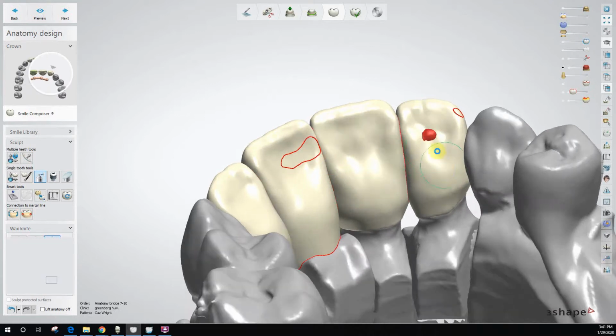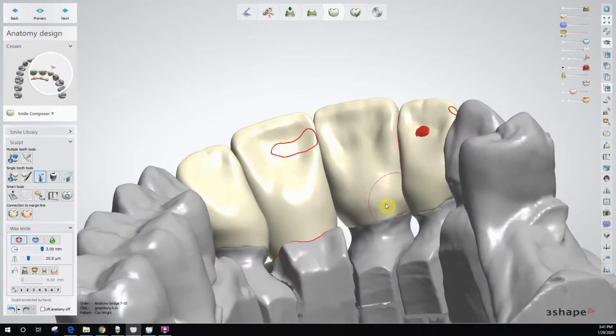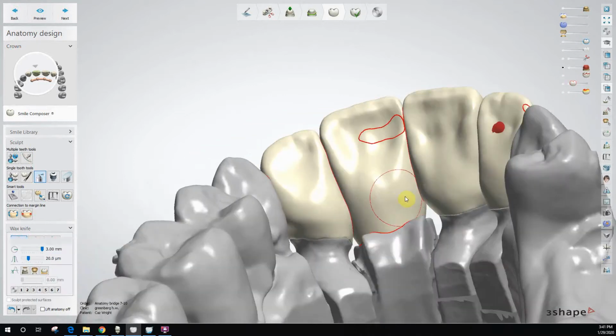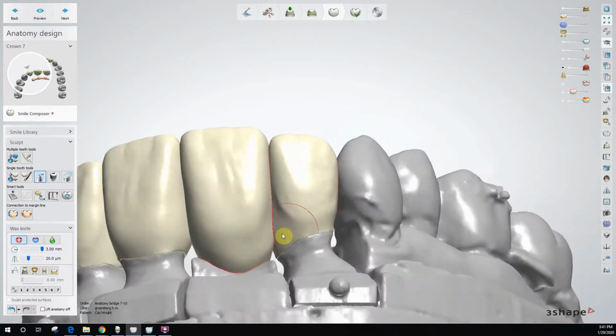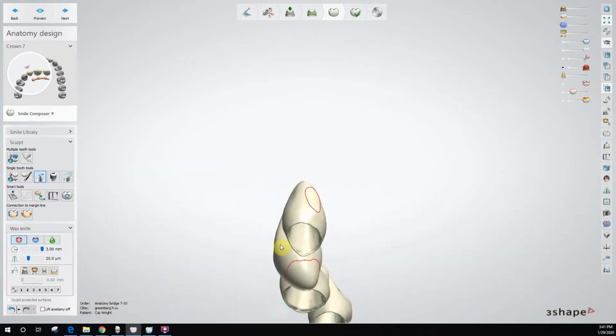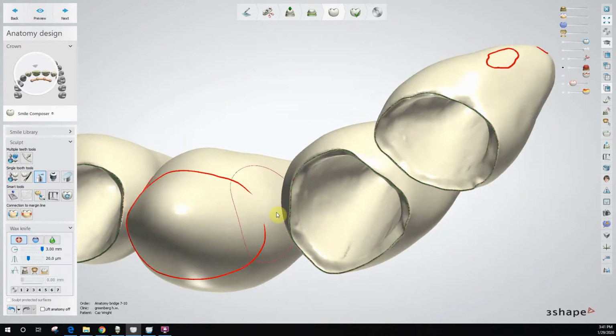I really want to make a lot of changes with a wax knife tool. G1 is adding back without over emphasizing change. I just want to add a little here, add a little there. 2 is take away, just a little here and there. I'll show you here in a second.